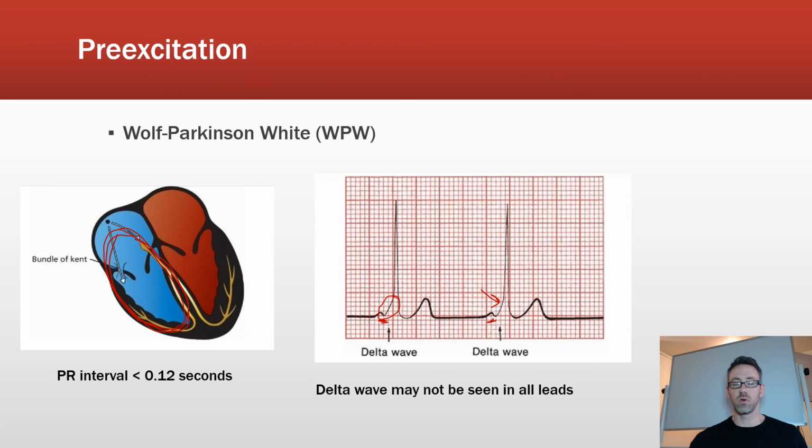Generally speaking, with the QRSs, you shouldn't see an upslope. It should go directly upward like a 90-degree angle. But here, instead, we're seeing this more gradual upslope. And that's referred to as a delta wave. So that's a delta wave.